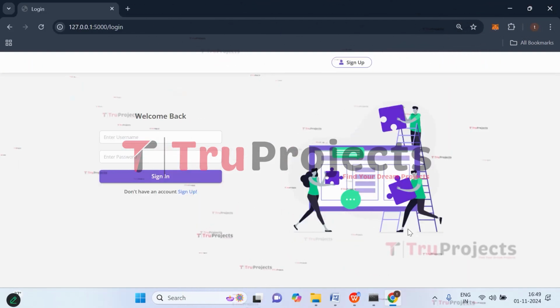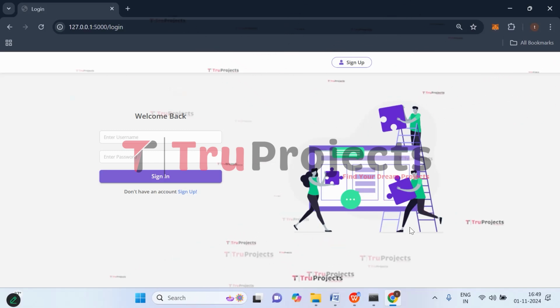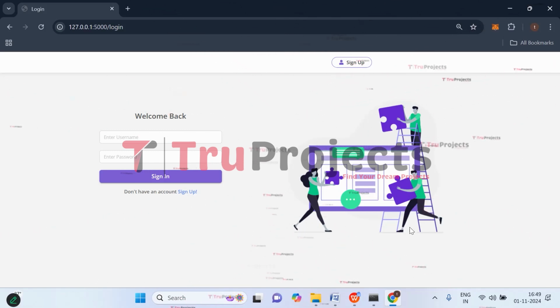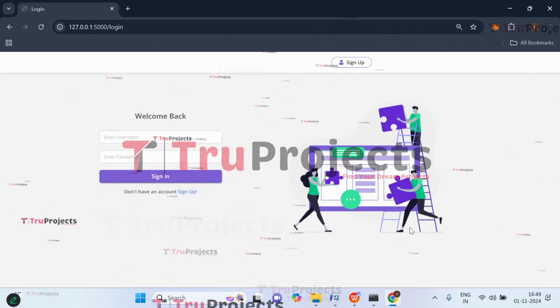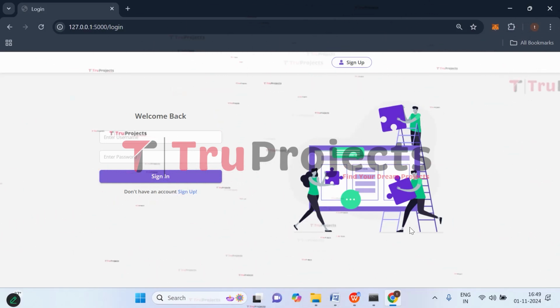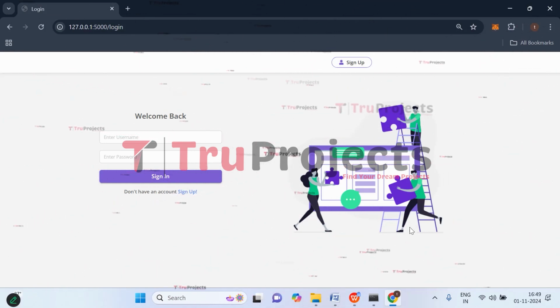Click on sign out. In this way, just by giving the images to the application, the advanced YOLO model will detect the thyroid nodule, whether it is benign or malignant. So this will be beneficial for the doctors as well as the patients. So this is all about the project.